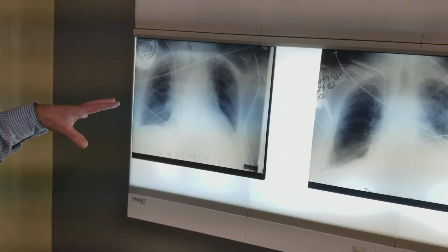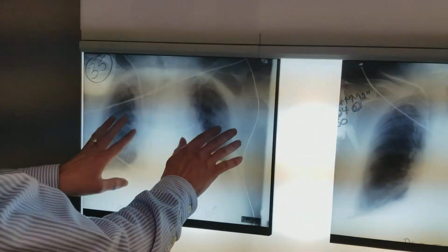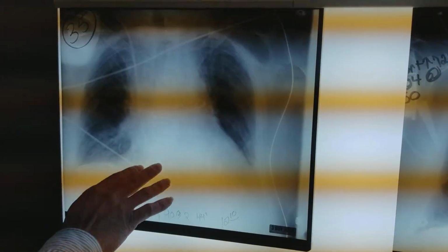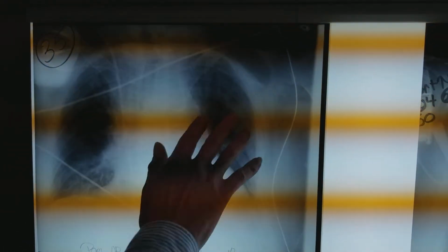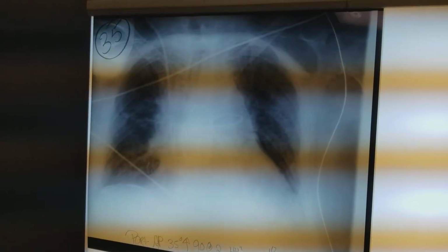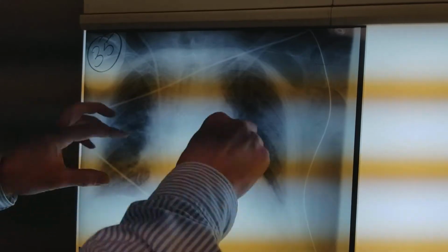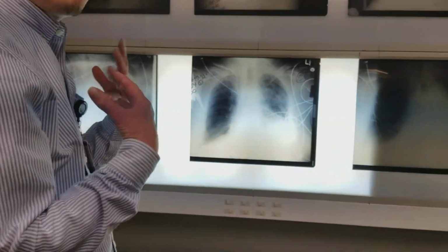And then this is more of a pattern of heart failure. This is congestive heart failure, and what this is really showing is it's not a great film. It's okay. The patient is a little rotated. They're off a little bit, but you're seeing a highly vascularized lung here, and that is usually significant for fluid or lung water in a cardiogenic pulmonary edema. So we just kind of see this cottony look sometimes, and the bat wing thing usually refers to highly congested pulmonary vessels, but I don't know that I've ever really seen the bat wing thing, but you're going to see increased congestion and fluffiness.